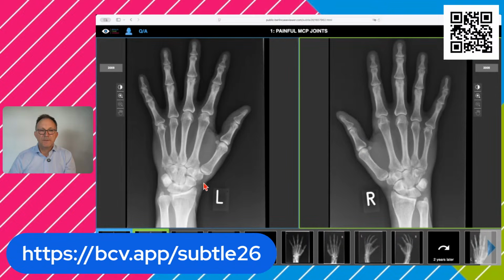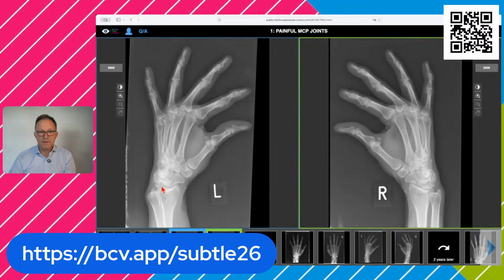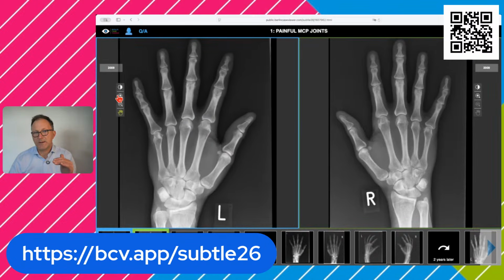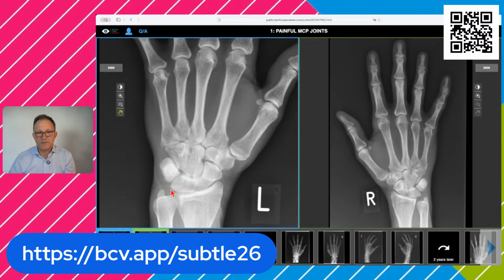So here we see the left and the right hand, and we also have the oblique images that we can look at here. But let's first start with the posterior anterior images. And when I approach these images, I always go joint group by joint group. That means I first focus on the DIP joints, then I go to the PIP joints, MCP joints, later to the wrist and the radiocarpal joint.